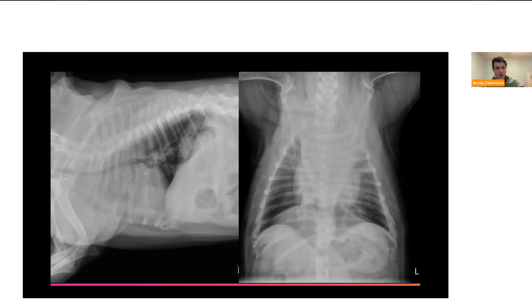And then this is a case of a dog with bronchitis. Brachycephalic breeds like your Frenchies and your Bulldogs often have a more conspicuous bronchial component. Whether or not it's clinically relevant is difficult to say. And you also have the competing aspect of, well, they also have brachycephalic airway syndrome. So is the coughing and respiratory issue related to that, or these lower airway changes? These are really tricky cases. My first rule of thought is, make sure the upper airway is okay, and then look to the lower airway, unless you have something very obvious that points you to the lower airway first with these guys.